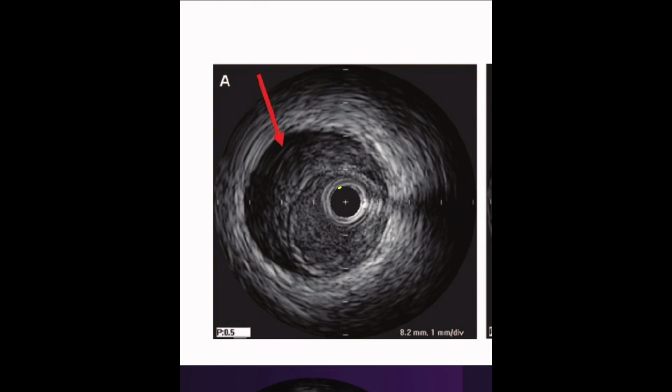But the first thing you're going to do is identify the IVUS catheter, right? And then you have those concentric circles that are all part of the catheter. The next color change is going to be the lumen. And what I want you to pay attention to here is even after that lumen and this shading here that's all about the same color, you do see the white, remember, would be what?